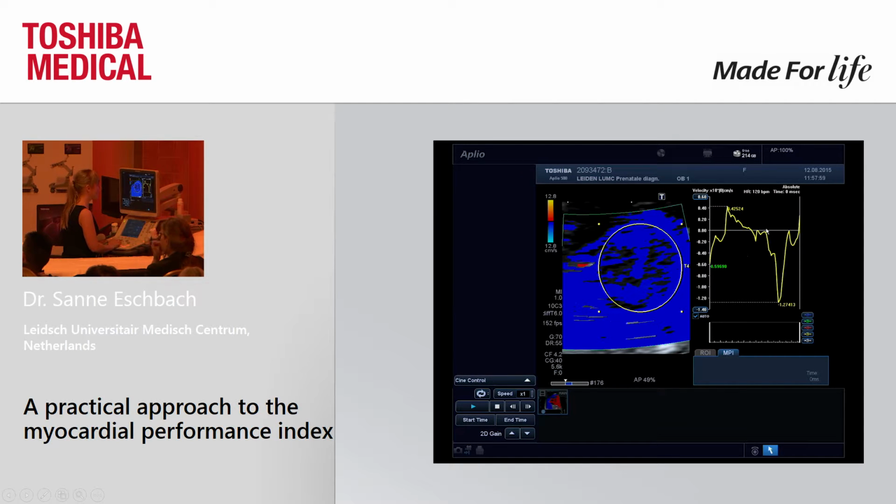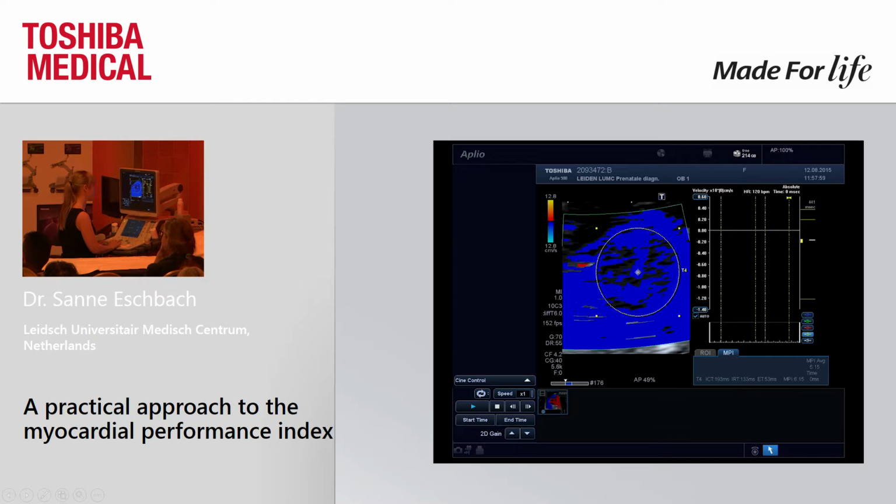So here again we have the cardiac cycle. Here we have the start of the contraction time. It's about here, the end of the contraction time. Then we have here the start of the relaxation time, as well as here the end of the relaxation time. And again, if you change the region of interest, the clearly marked points don't change with it. So another user can make another region of interest, but still you would find the same measurements.